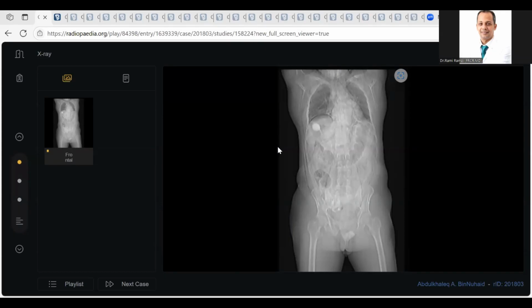Apart from that, the lung parenchyma is unremarkable. However, the right lung volume appears to be reduced, with an elevated right hemidiaphragm. Some sort of tubing or instrumentation is noted below the right diaphragm. The continuity of the tube I am unable to trace.